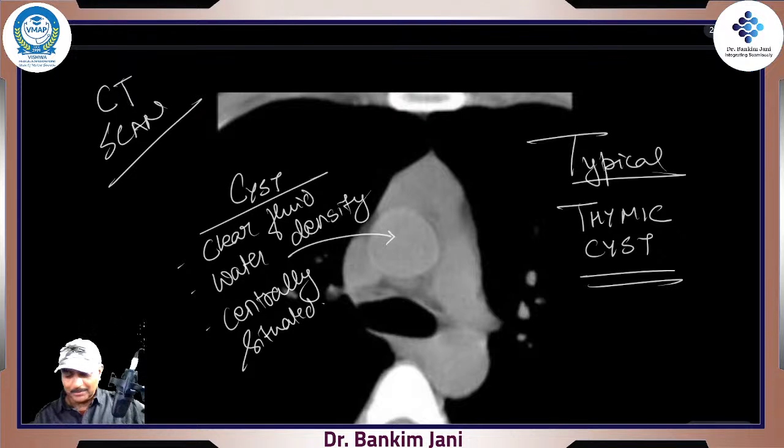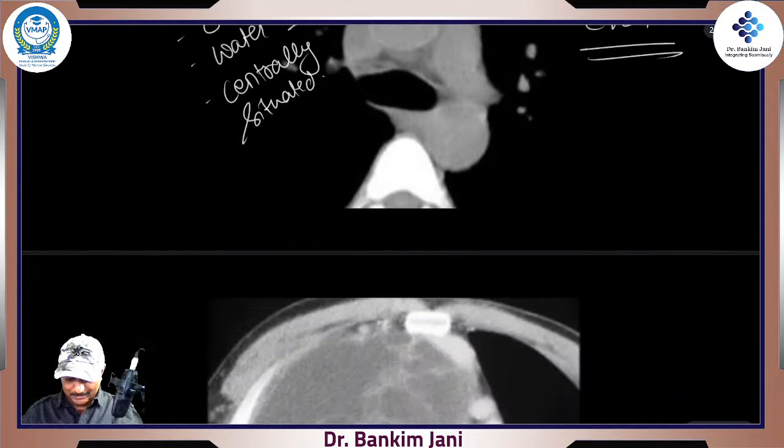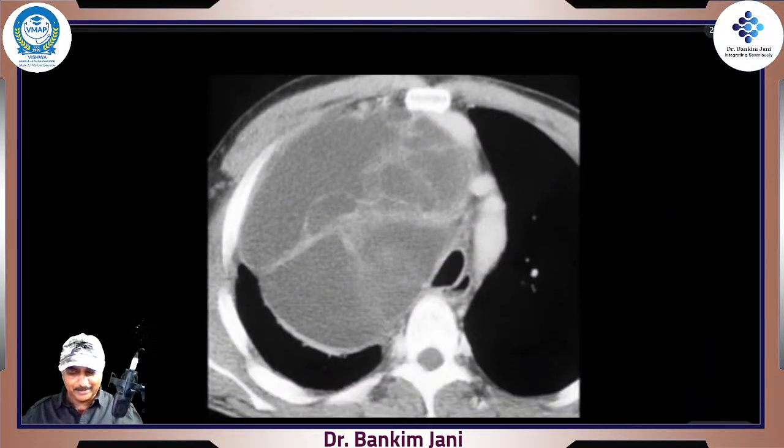Once you take the CT scan plate and being in first year, you watch it and you say, this is clearly defined thymic cyst, and the rest of the audience will faint. More is yet to come, and see how easy it is. Trust me, all of you will be able to diagnose the next CT scan. Here it is.